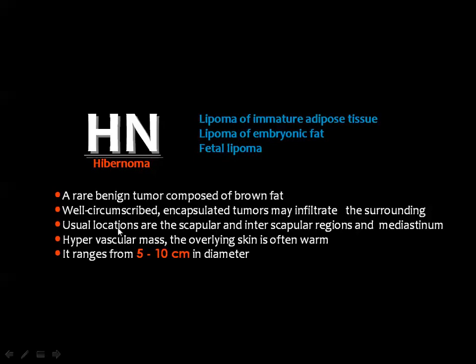Then we come to the hibernoma, which is known as lipoma of immature adipose tissue, or lipoma of embryonic fat, or fetal lipoma. You see that this lipoma will arise from the brown fat, or the fat of the fetus, and it will appear almost exactly similar to the lipoma, except for some differences.